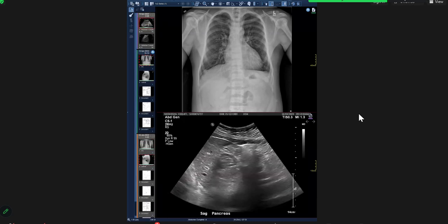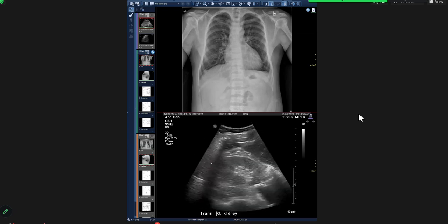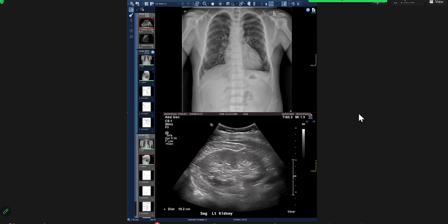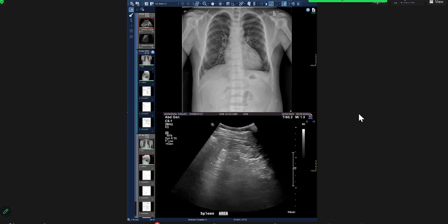Okay, so when a person has an acute chest syndrome, what do you expect to see in that? Airspace disease changes. And the cardiac size is mildly large due to the underlying disease. However, in acute chest syndrome, there are lung changes due to the infection.